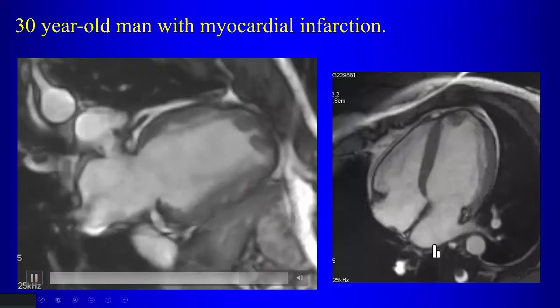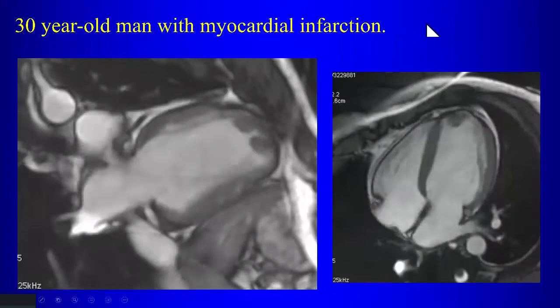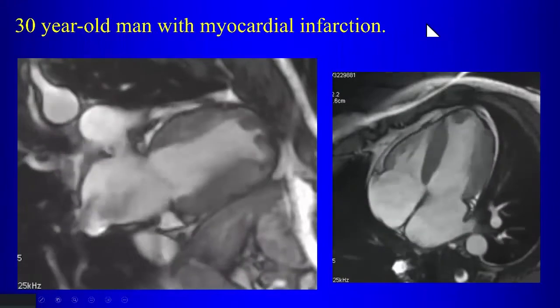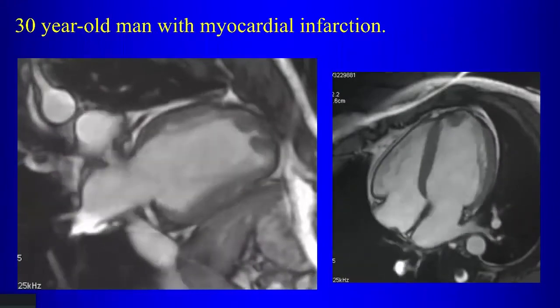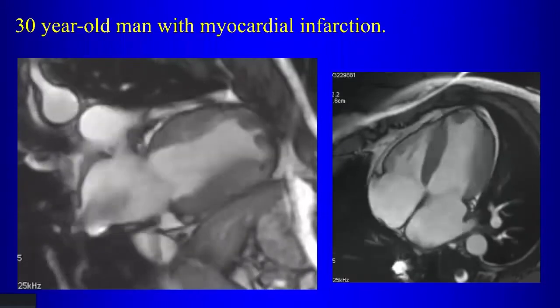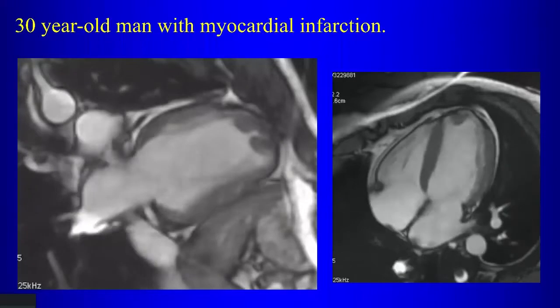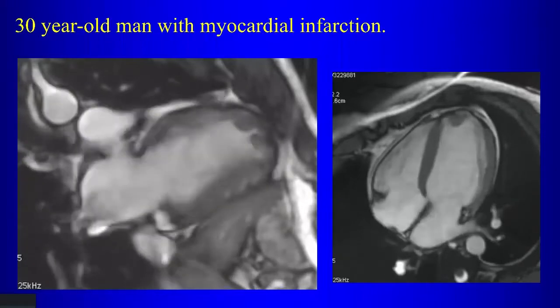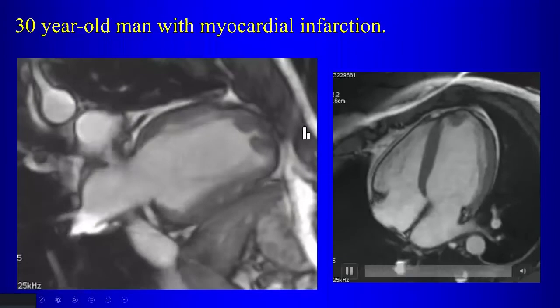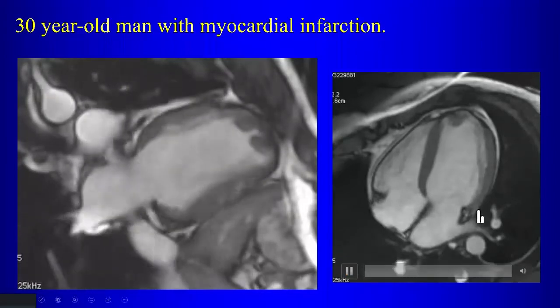So, you guys over here, this patient has a history of myocardial infarction. What sequences, what views are we looking at? Speak into the mic. Right, so these are SSFP, so this is a 2-chamber view, and this is a 4-chamber view here, okay?